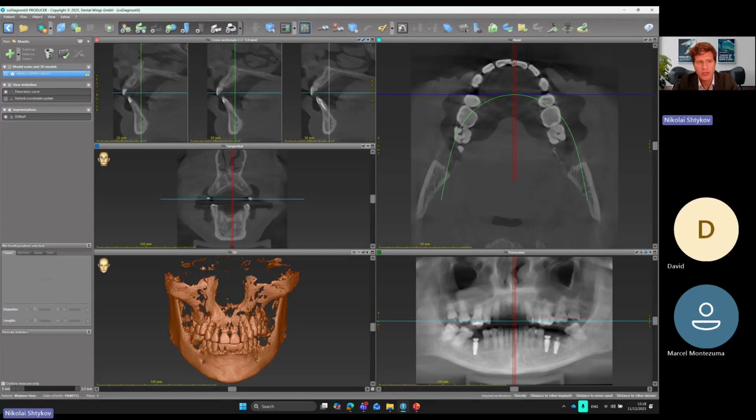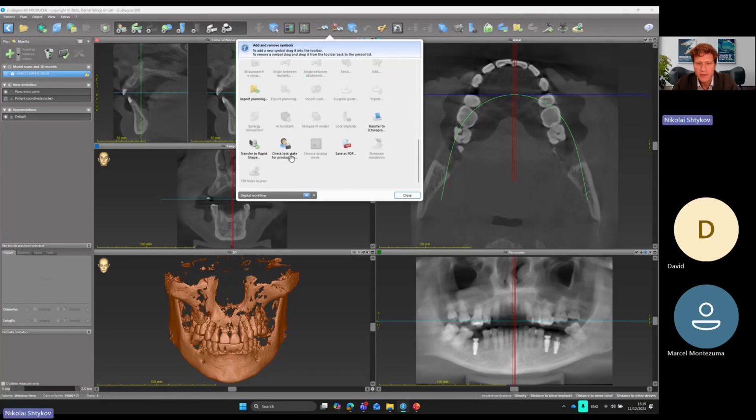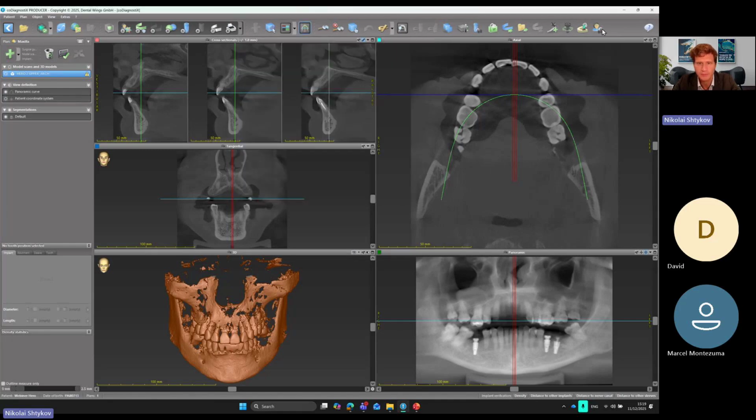While we are waiting, I will explain a little bit about the windows and the interface here. You see that the AI assistant already finished, but I will still explain. I have here a lot of different options and how to add them. The same way: right mouse button click, adjust, and you can add something you would like to see in this top bar, for example, this icon.